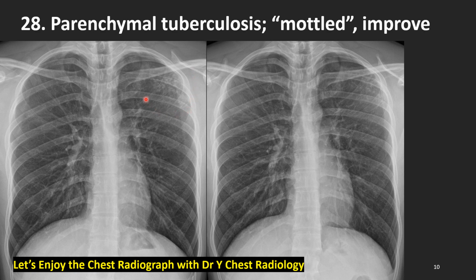Left upper lobe lesion here. How about right upper lobe? Yes, it's clear. Something crowded with ill-defined nodules, mottled nodules. These densities shouldn't be here in normal person. How about these findings several years after? Yes, not so much crowded than before, and the nodules margins are relatively clear, fine, and densities are smaller than before. Yes, this is healed TB, inactive TB.